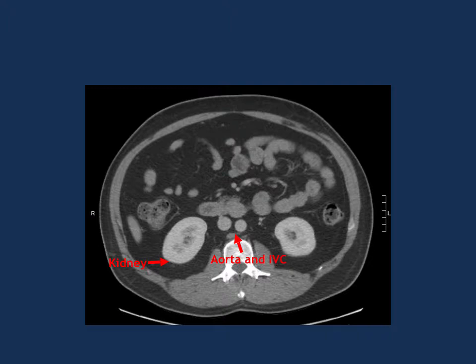The structures you want to think about are the right colon and left colon. There's the ascending colon. We see the ascending colon there. And how do you know it's the ascending colon? There are a few things that clue you in. One, that's in general the anatomic territory, given that it's adjacent and anterior to the kidney, so it's on the retroperitoneum in front of Gerota's fascia of the kidney.